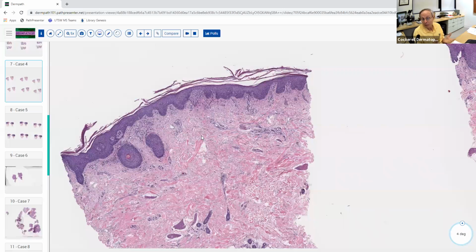We see a lot of biopsies get submitted to us as rule out PRP that turn out to be psoriasis or atopic dermatitis or something else, because those are clinically in the differential diagnosis, or mycosis fungoides. But histologically, when you've got this pattern, it's really pretty classic.